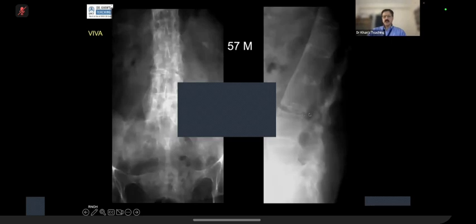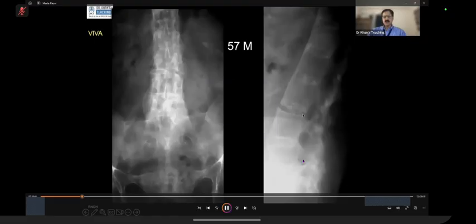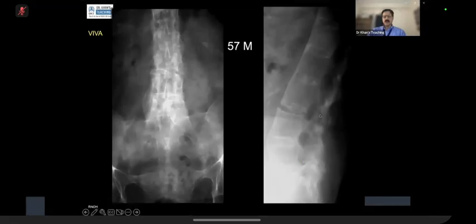And when it goes through it, then it goes posteriorly. And look at fracture lines in the posterior elements. So this is what we call a three-column fracture, and always look at the posterior elements. And of course, the anterior longitudinal ligament ossification is also lost here.